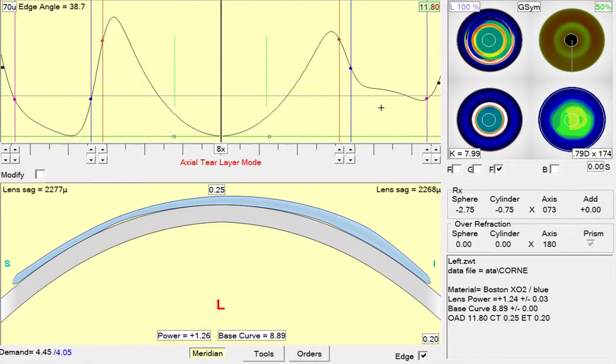So since we're in freeform, this change only affects the bottom half or so of the lens. We can either click up or we can just simply go over to this side and see this is the superior part of the lens now. We're at 752 and 2005, so our new endpoint will be 732 while maintaining 2005 here.